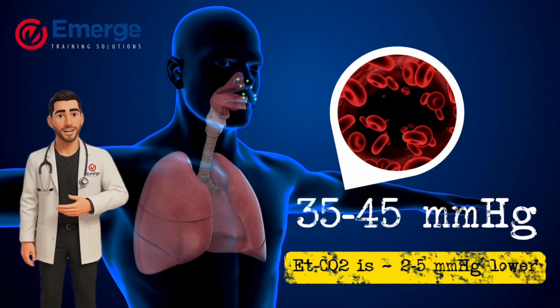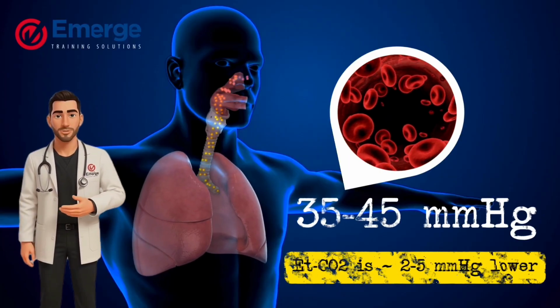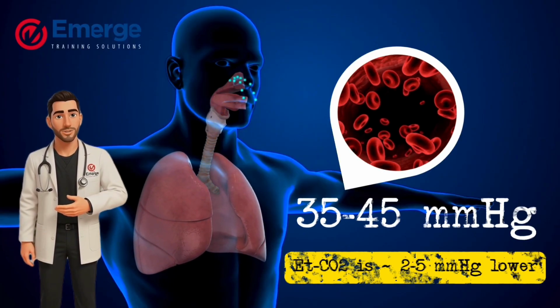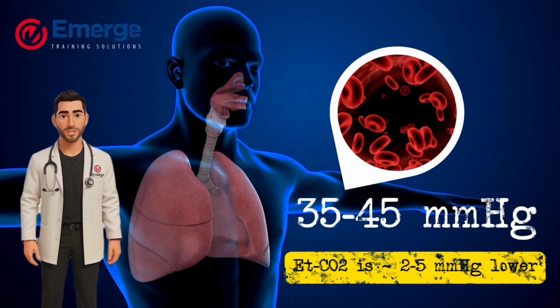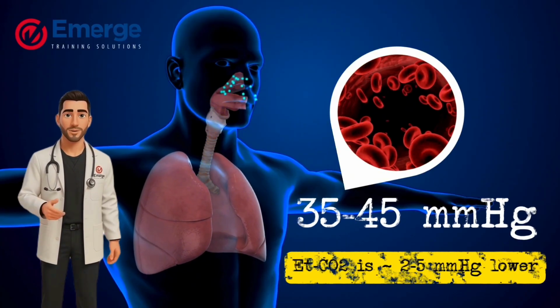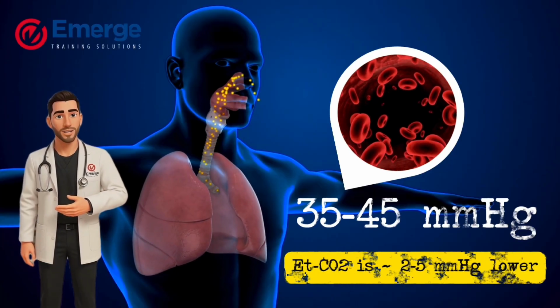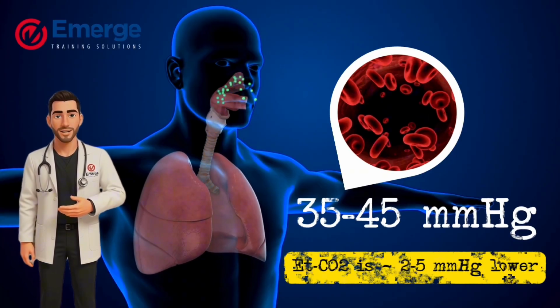But when it starts to widen, like in shock, pulmonary embolism, or severe ventilation-perfusion mismatch, it's an early clue that something's wrong with either perfusion or gas exchange efficiency. That's what makes end-tidal CO2 so powerful. It doesn't just tell us about ventilation, it tells us how well the whole cardiorespiratory system is working together.